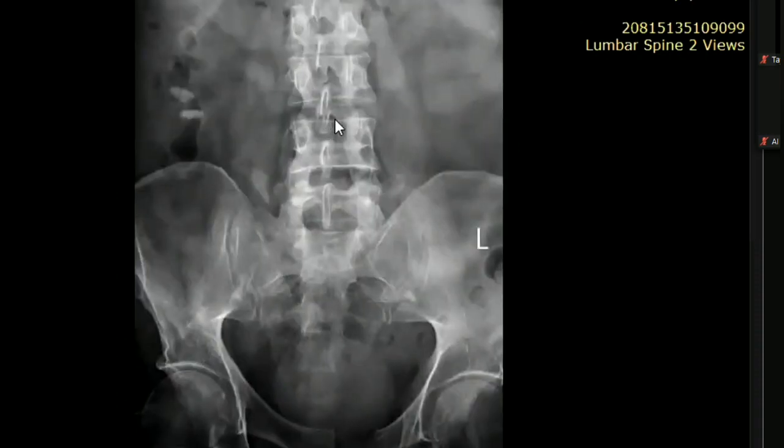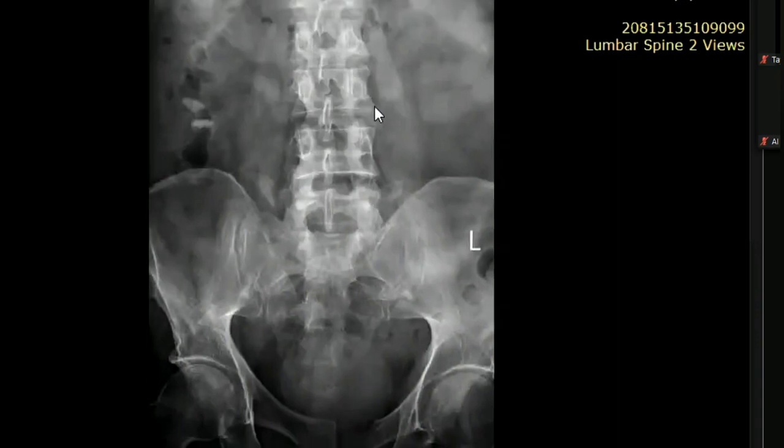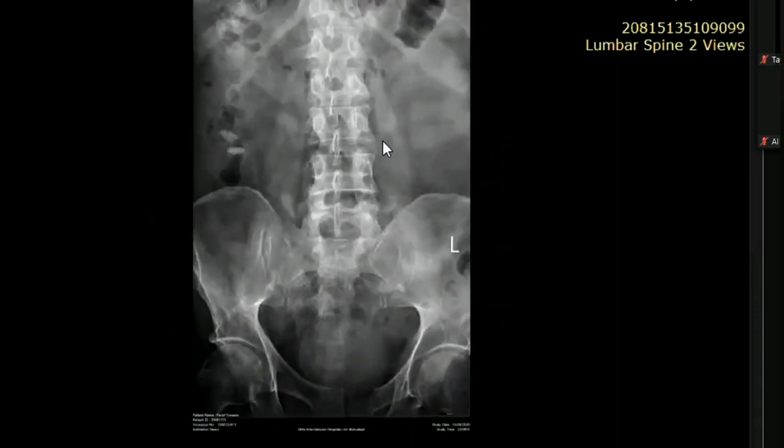Yes, very nice description. For the X-rays, the take-home message is they will give you a film with some positive finding at the periphery of the film, and always review the periphery very carefully, and always look for the symmetry. Allah Pak has made two sides so that you can always compare and pick the pathology, right? So yes, this bone has its cortex completely gone. You are right that this finding is picked up nicely, and nobody would expect that you gave a diagnosis, and you approached it well, and the differentials were fine.